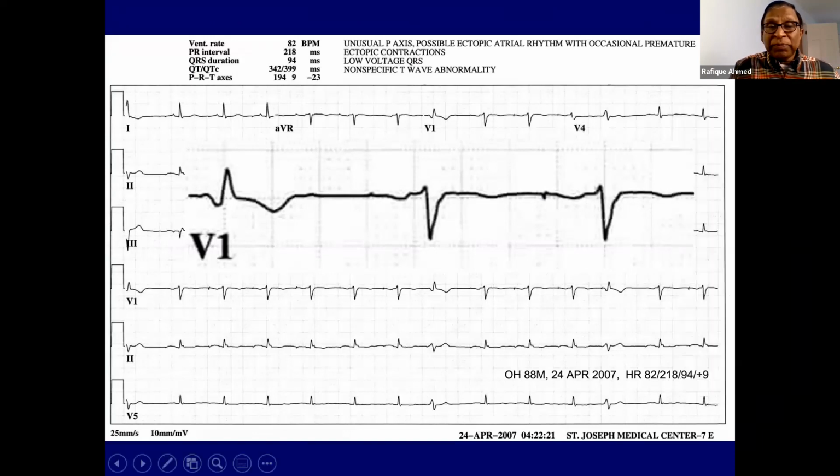There is no magic wand that I find out this ECG. A lot of times I just investigate. I see something, I think it is a pacing spike. And the other thing is, can it be an artifact? If it is an artifact, it will not be present in every QRS complex. So you can see where my pointer is. There is a pacing spike. There is a tiny one here and a tiny one here. So it has to be consistent. Otherwise, it can sometimes be artifact.